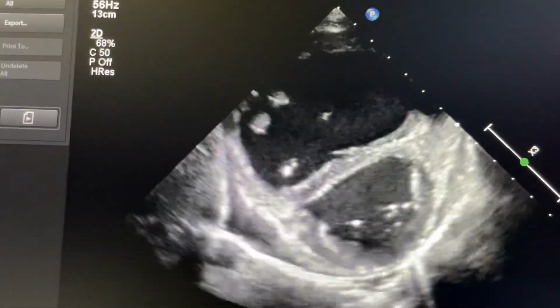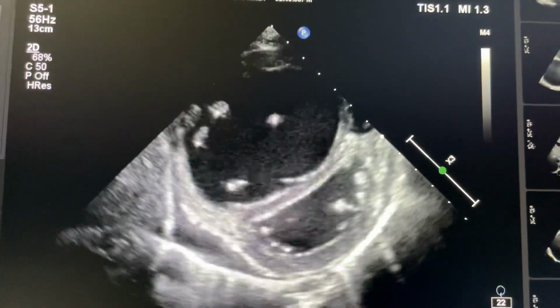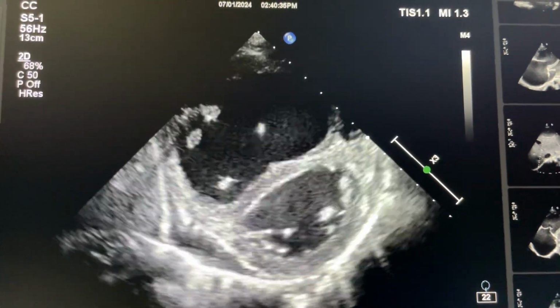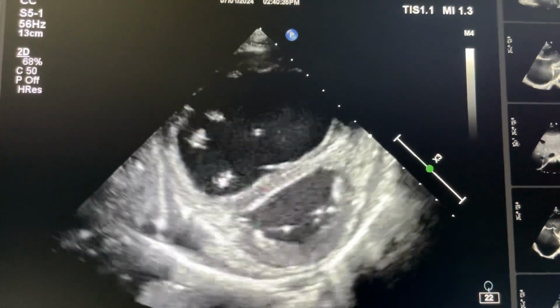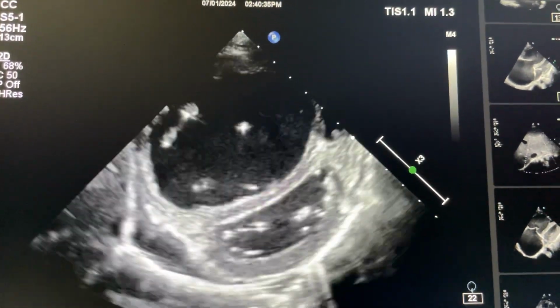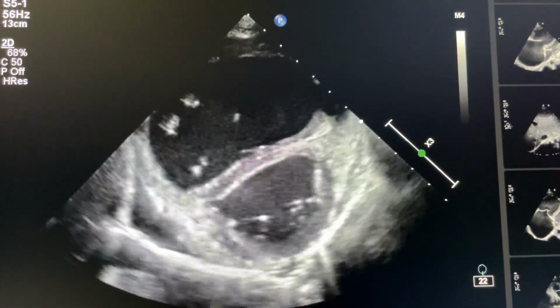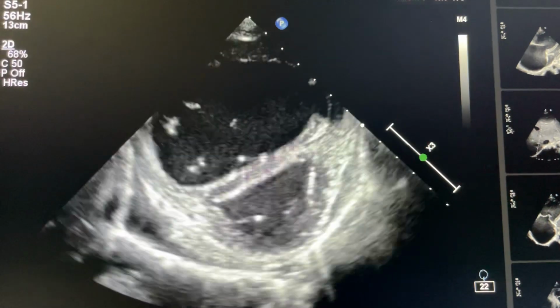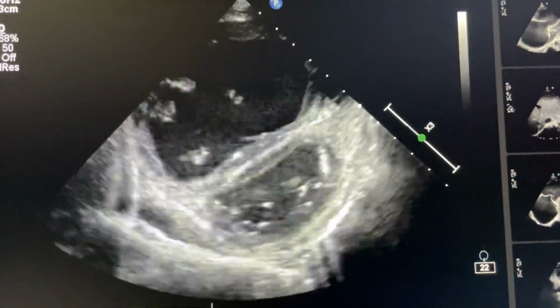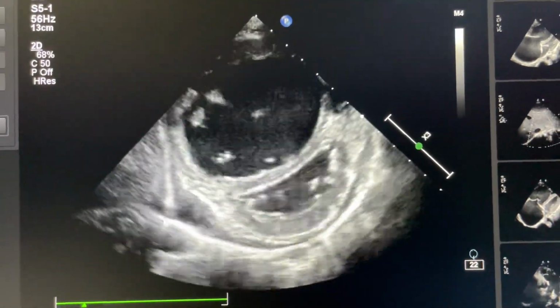Everything happened over 6 months of duration. The patient is only 21 years old. On X-ray there is significant cardiomegaly, but the pulmonary parenchyma and pulmonary zones are all normal, with the pulmonary artery enlarged. So ultimately this case comes towards primary pulmonary artery hypertension. So this is the case of primary pulmonary artery hypertension.